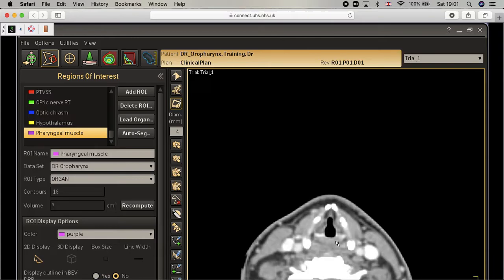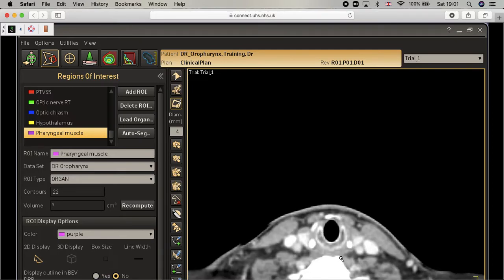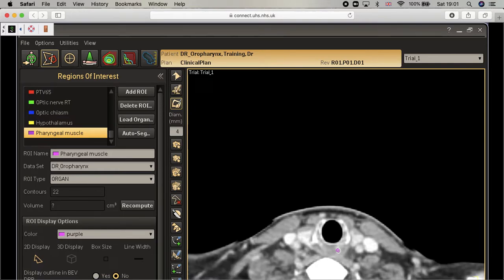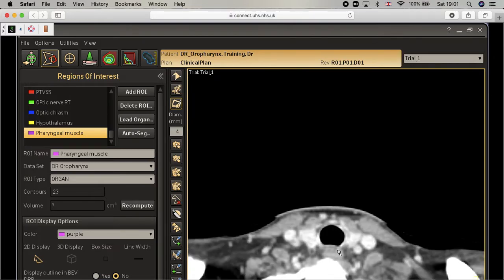When the cricoid cartilage starts to appear, they will call the muscle now a cricopharyngeal muscle, and the cricopharyngeal muscles are the thickest part of the pharyngeal muscles, and you just have to draw in between. It's thick, you can see it, in between the cartilage. It's very easy and very simple. And you'll see that it will start to be the esophagus, and if you go down, then the esophagus will start to be a circle, and then the esophagus will continue as usual, as we all know, the circular muscle of the esophagus.